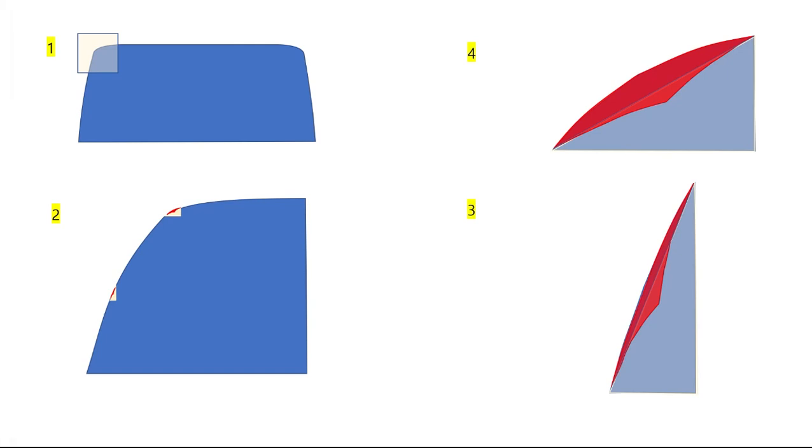machining. Figure 2 is an enlargement of the rectangular part in Figure 1. Figure 3 is the residual area after machining a relatively straight part. Figure 4 shows the machining residue of a deeply curved area, colored in red.